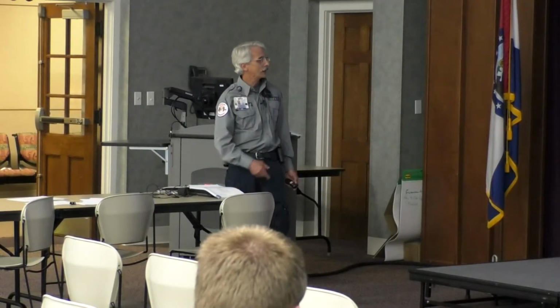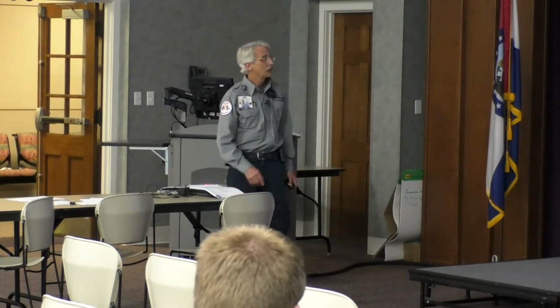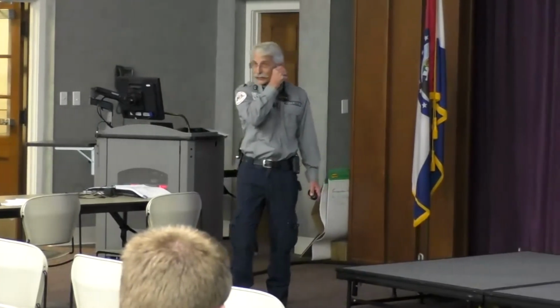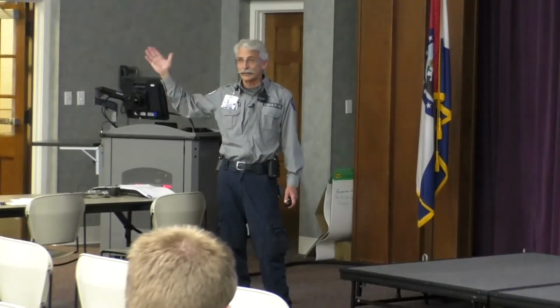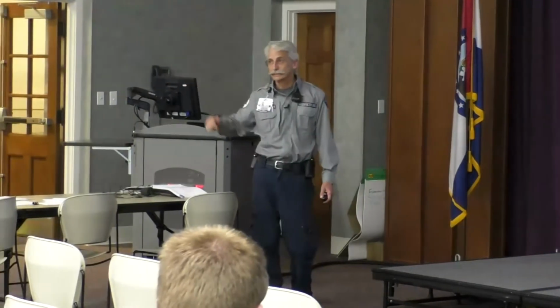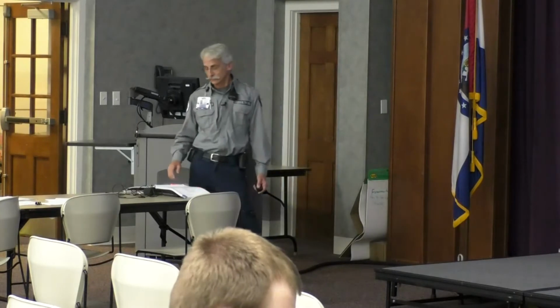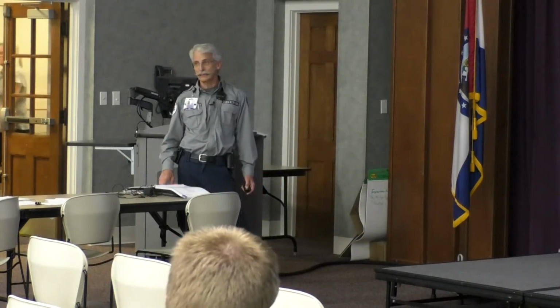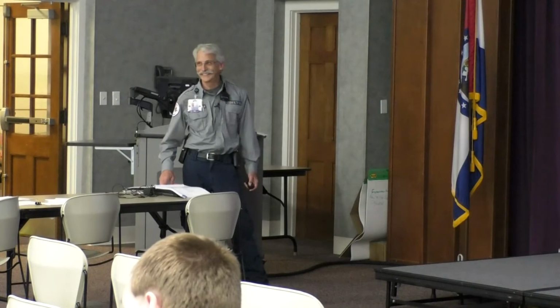Okay, now I can come back to here and look at all the answers to all that. The other thing I like about the LifePak 15s is they now start giving you ST elevations out on the right-hand side. That's sweet. That is nice. Don't just believe them, but I haven't found them to be very far off.